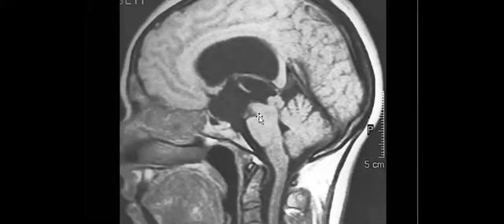Why didn't you say suprasellar arachnoid cyst? From one image, I agree that it will be difficult, but if you see this bowing, this means that it is not just a cyst. There should be dilatation of the lateral ventricle and dilatation of the third ventricle. I actually can't see the tunneling or funneling of the aqueduct. It can be. I agree. From one picture, it cannot be specific for it.